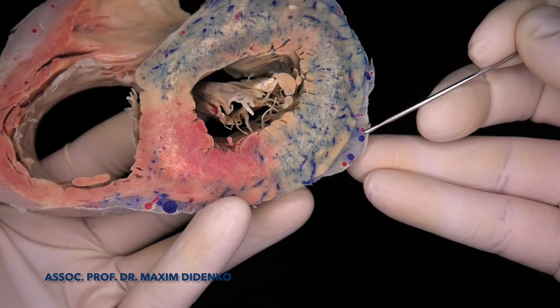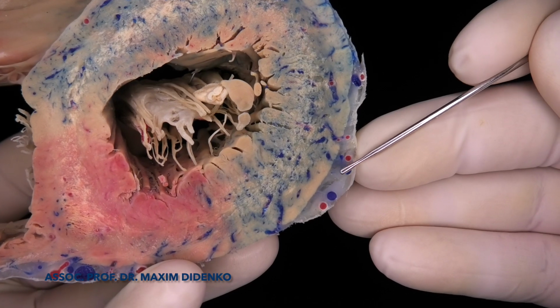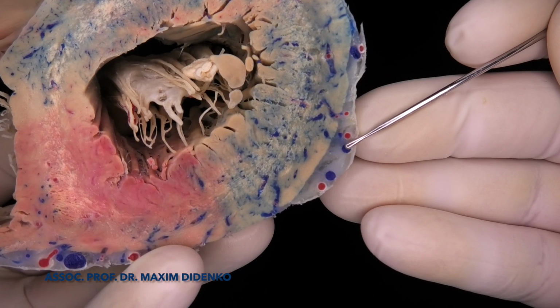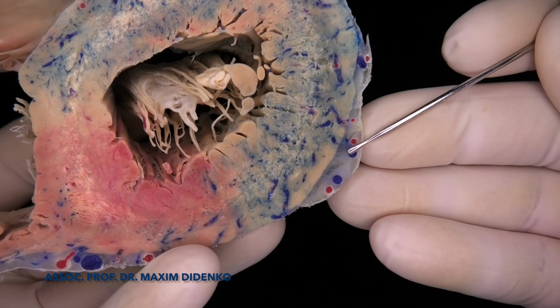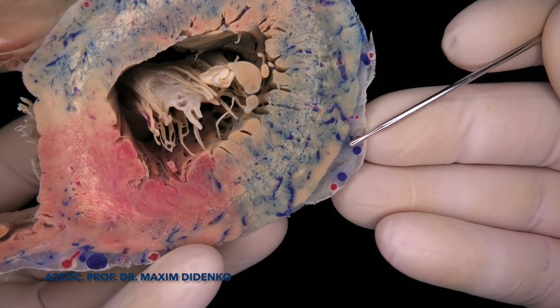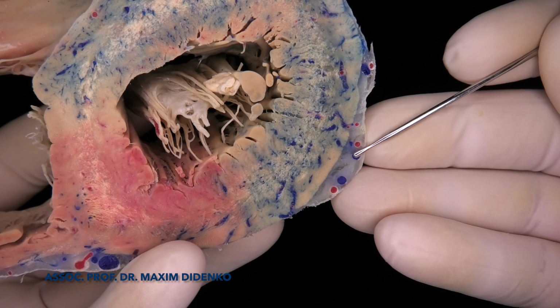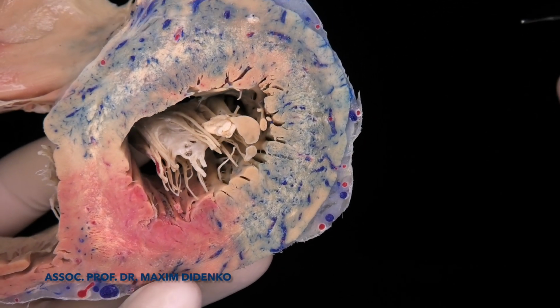And we can see that in some veins, in between the vein and myocardium, we can recognize fat tissue, which of course will be an obstacle, a barrier for impulse propagation, creating a higher threshold when the pacing is from this vein or from this vein.